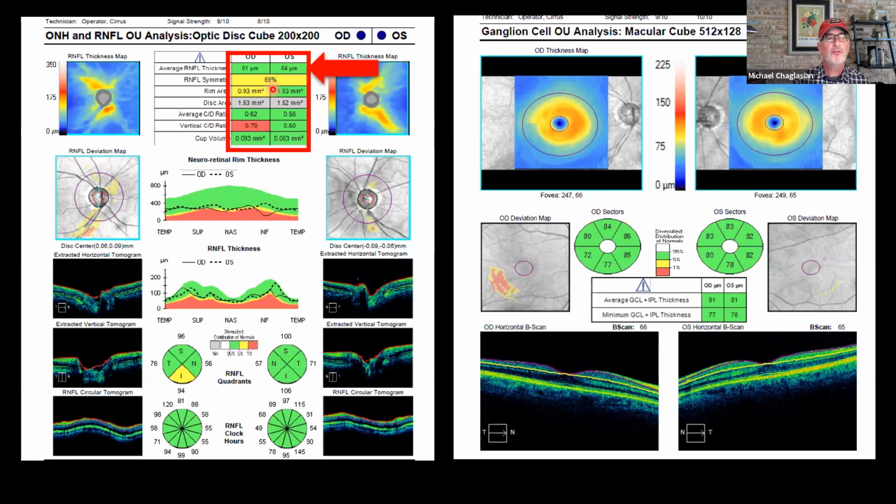So that's when you can have a patient with glaucoma and the color coding for the average RNFL thickness is still in the green zone. We'll probably also look at, I would look at the disc size to identify large discs versus small discs. I don't typically look at the CD ratio. Some people like to do that because they find judging CD ratio difficult to do. It's different from how you do it ophthalmoscopically at the slit lamp. If you like to do it, okay, but you really still need to be looking at the optic disc ophthalmoscopically. Next, there's the disc area.